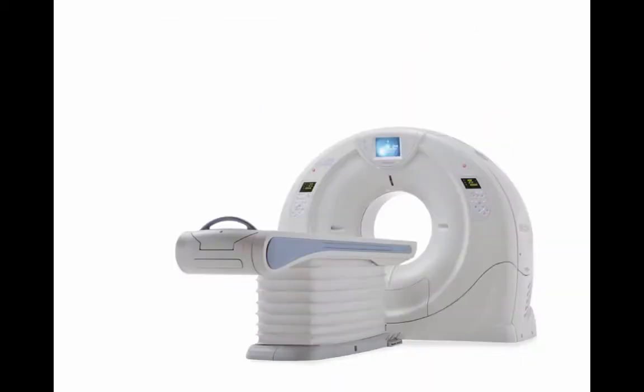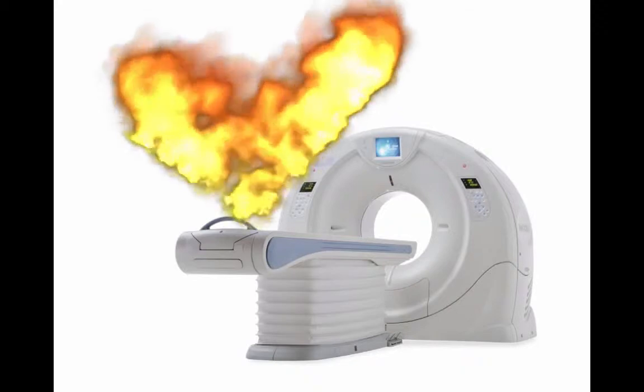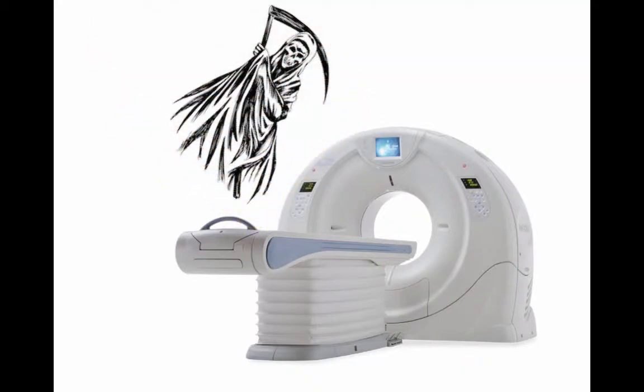Sometimes a CT scanner is not the right place either. Right? We've all seen patients crash and burn over in the CT scanner. It goes from being the tube of truth to the donut of death pretty quickly if you send an unstable patient over there. Sometimes this is not a reality, and the only diagnostic modality we have at the bedside for this is ultrasound. So again, being able to take a look at that aneurysm and detect rupture versus not rupture can be very helpful.